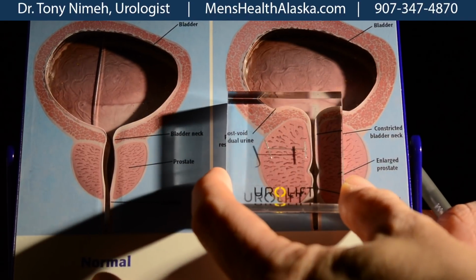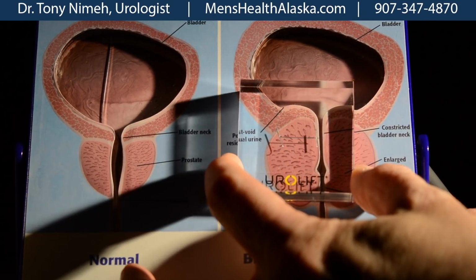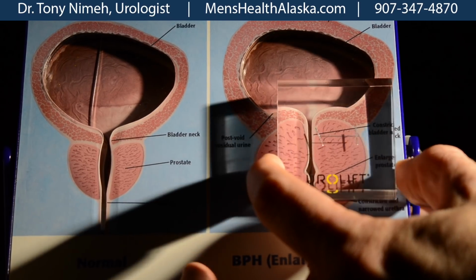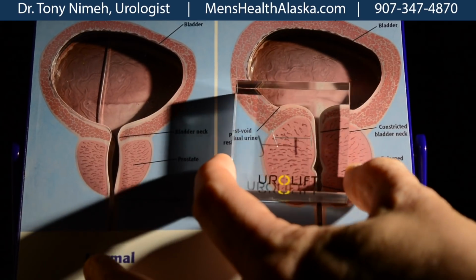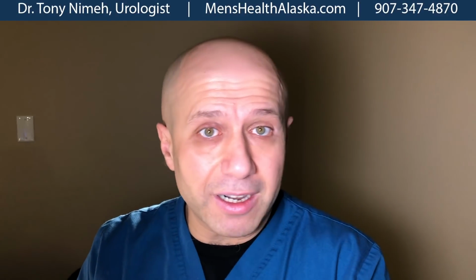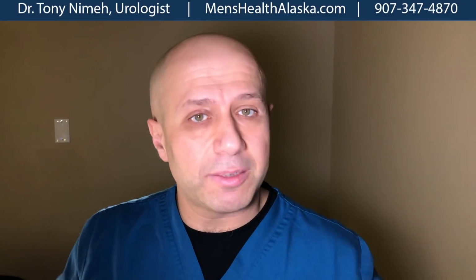So basically, the outside clip goes on the outside of the capsule of the prostate, and we do one or two here, or even three sometimes, depending on the size of the prostate. And same thing on the other side. One clip goes on the outside of the capsule of the prostate, and the other one goes on the inside. So now this tube here is getting opened up, because we put one clip here, another one here, another here. So now the passage inside the prostate, which is the urethra, gets opened up. And if it gets opened up, now the bladder is going to be able to empty the urine. As the bladder has a bigger passage to get the urine through, all the symptoms start getting better.